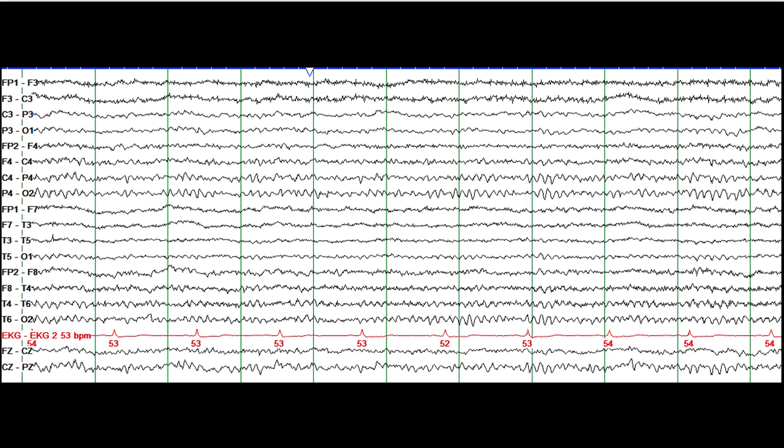And if you got that answer correctly, congratulations, you are progressing very well in your interpretation of the EEG. If you were not able to get the answer, if you were not able to identify the asymmetry between the two hemispheres, I would suggest go back to slide number 1 and look over it carefully a few times at least so that you can develop your comfort level.